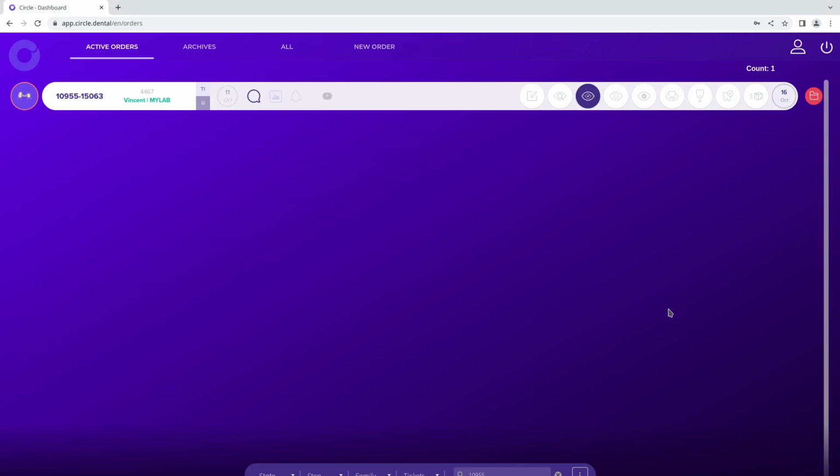This is a video to explain how Circle Prepare works. So when you are on the dashboard, you can see your case. Here I just selected my own case. I can see it here on the dashboard. Usually you have many more cases.